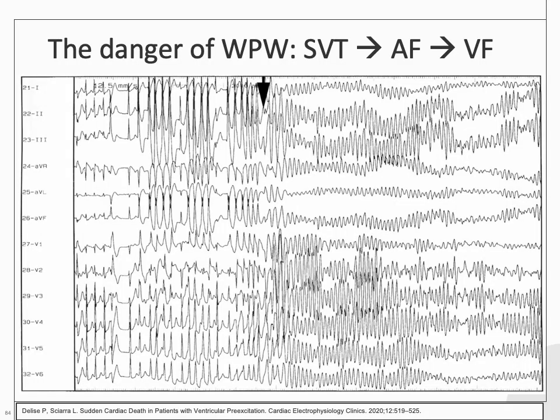This is a nice summary ECG which shows AVRT triggering pre-excited atrial fibrillation, which then triggers ventricular fibrillation. This nicely highlights the danger of accessory pathways and the importance of the delta wave or Wolff-Parkinson-White pattern on ECG, especially in patients presenting with syncope.